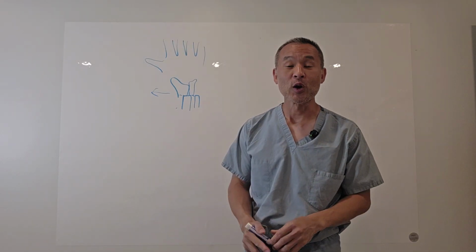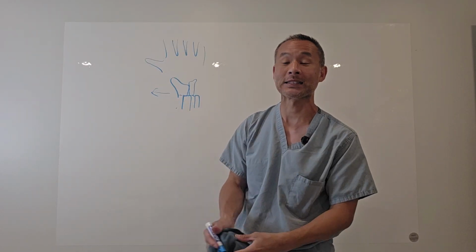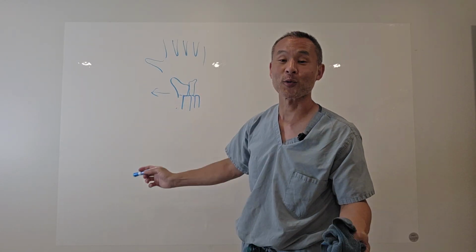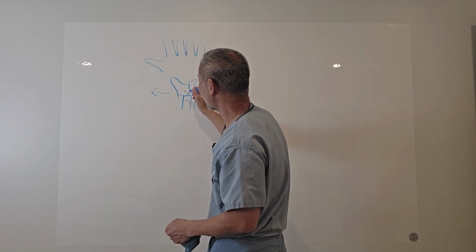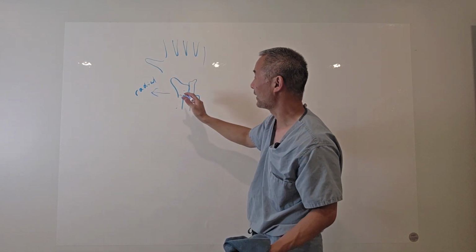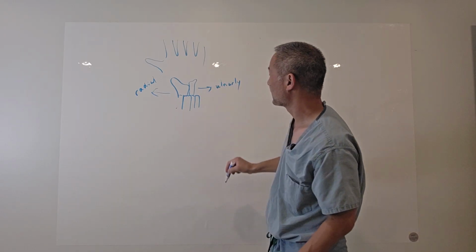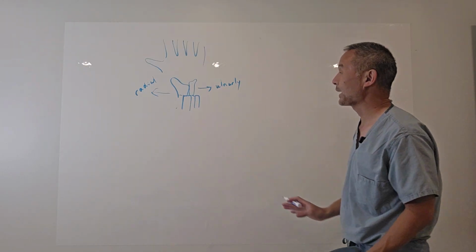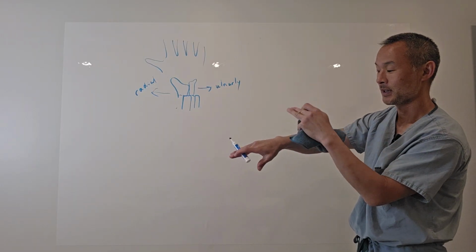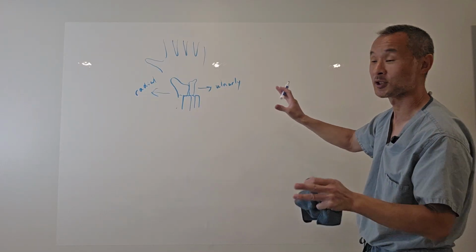To remove that confusion, we just eliminate medial-lateral when it comes to anything past the elbow. Instead of medial to lateral, we say towards the radius or towards the ulna, or in other words, radial or ulnar. So this fracture, we'd say it displaced radially, and if it went the opposite way, we'd say it displaced ulnarly. The same thing applies on the other plane, anything past the elbow. So we're talking forearm, wrist, metacarpals, phalanges, anything past the elbow, we're going to use this terminology.